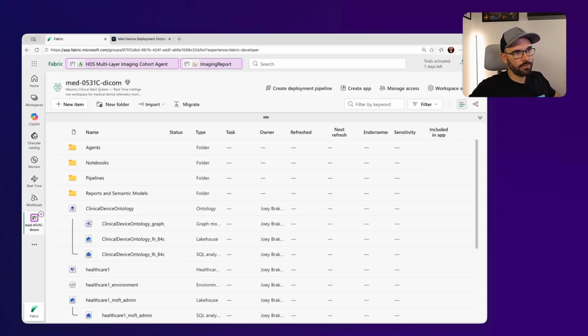Okay, we're here in Fabric with the now deployed solution, and we'll be looking at this project and what it deployed to help us identify which analytical processes might make the most sense based on your need. We'll first start with the data agent.